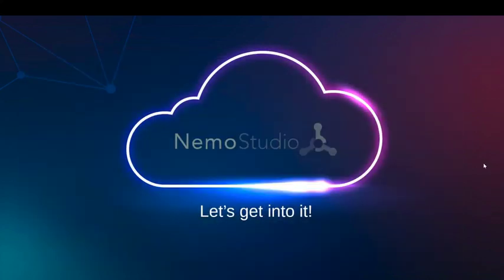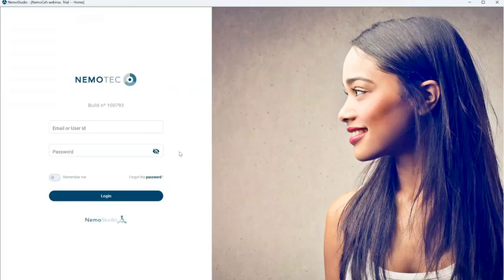Okay, so now let's get into directly the Nemo Studio platform, and let's see together the differences of the cloud version. All right, perfect. So we see that we are directly taken into the initial login, the initial interface of Nemo. We can see that I have opened the Nemo from my desktop app, but I am directly taken into the cloud interface, the login into the cloud.